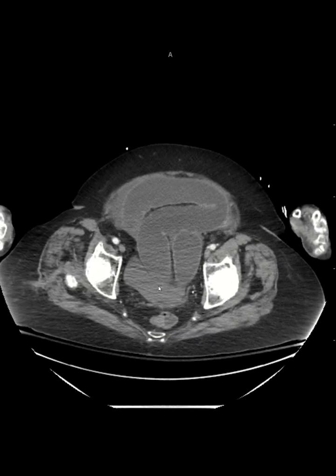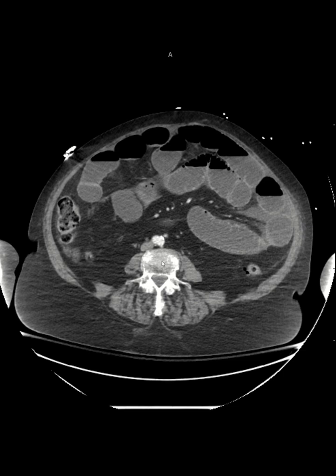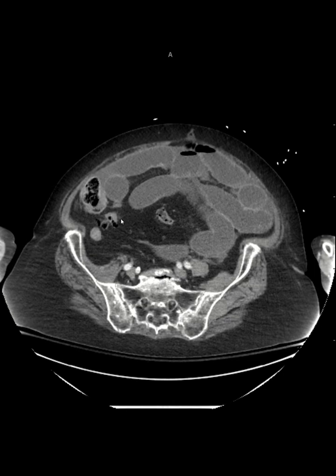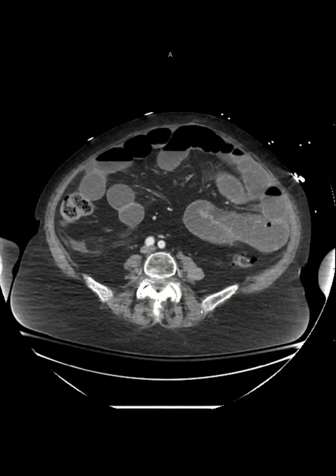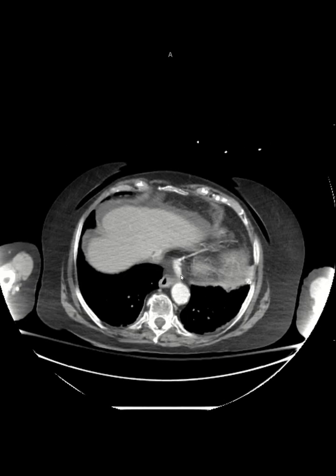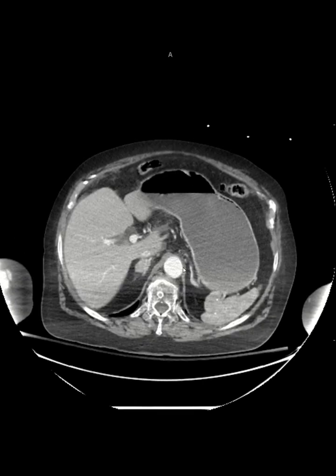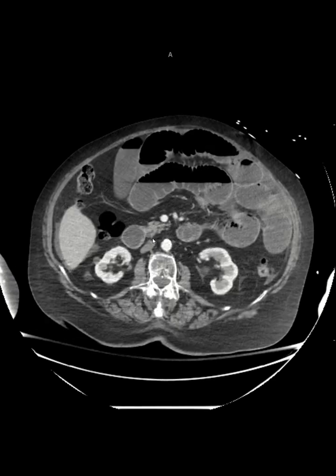Uterus is absent, urinary bladder is unremarkable. Colon shows distal colonic diverticulosis. And the other findings include a Lynx device at the GE junction, cholecystectomy, and prominent extrahepatic CBD.